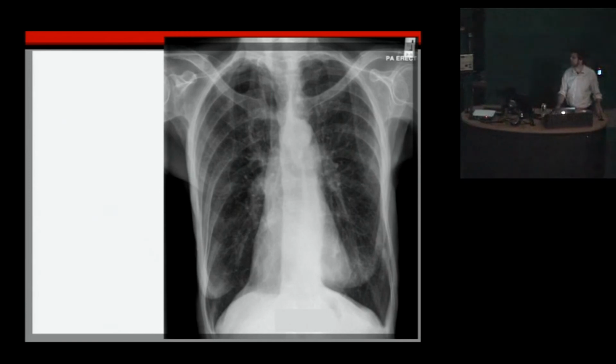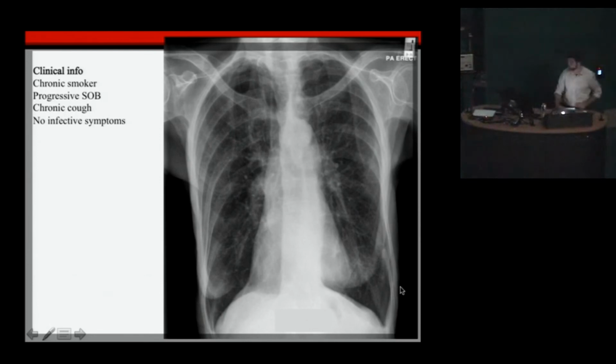Very tall. So, diagnosis or thoughts? Yeah, so COPD. So again, you have the scenario. It is difficult to see the anterior ribs on this one, but trust me, on the screen here, you can see them, and it does look expanded, and the flattened diaphragms here. Okay, and what? So you see, there's these black areas here. What are these? So bullae. Yeah. So bullae of COPD.